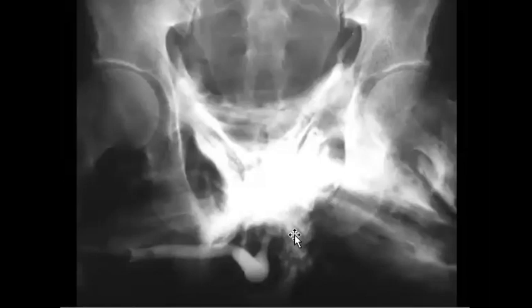Yeah, so it is urethral injury. Nice. Perfect. At the level of the urogenital diaphragm. So is it above or below or both sides? It looks like both sides of the urogenital diaphragm. Both sides. Perfect. So in this type, you are talking about urethral injury, and if you want to classify, maybe you can give it type 3. Yes. Because it's above and below.